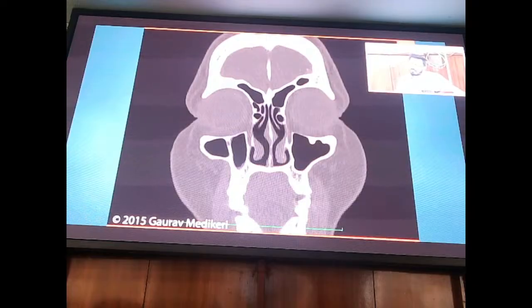Now the infraorbital nerve always supplies this part of the cheek. That is why whenever you do a frontal sinus trephine, maxillary sinus trephine by using a trocar, I think yesterday Nitishore and I were having this discussion, there is a very high chance that you will damage some fibers of this infraorbital nerve. Because if you look at the scan here, after coming through the foramen, it will actually go down. It will also supply the teeth lateral to the lateral incisors. Okay, and also this cheek.